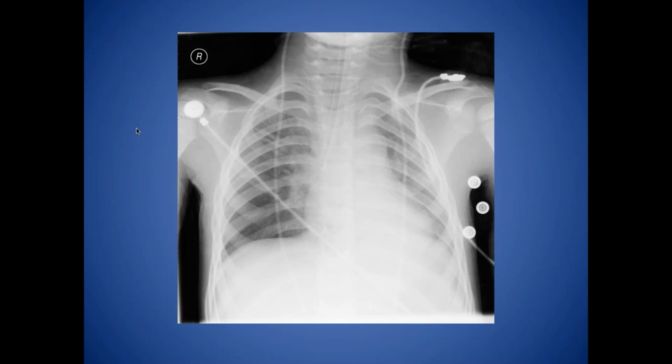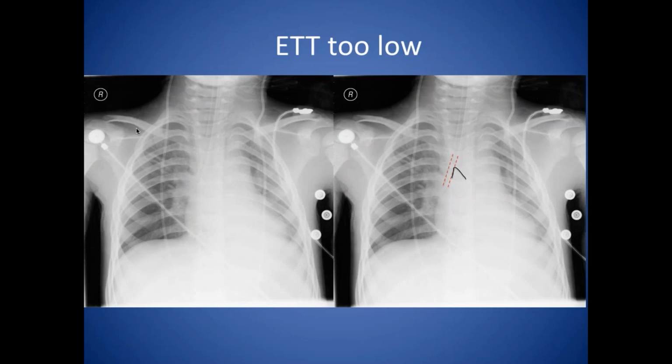This is a young patient, 4 years of age, who has an endotracheal tube placed in the right main bronchus, presumably because it was too large, and the patient attended an adult hospital. This has resulted in consolidation and collapse of the right upper lobe, and there is early collapse of the left lower lobe. Note the bilateral VP shunts. So again, this shows that the ET tube is beyond the carina in the right main bronchus.